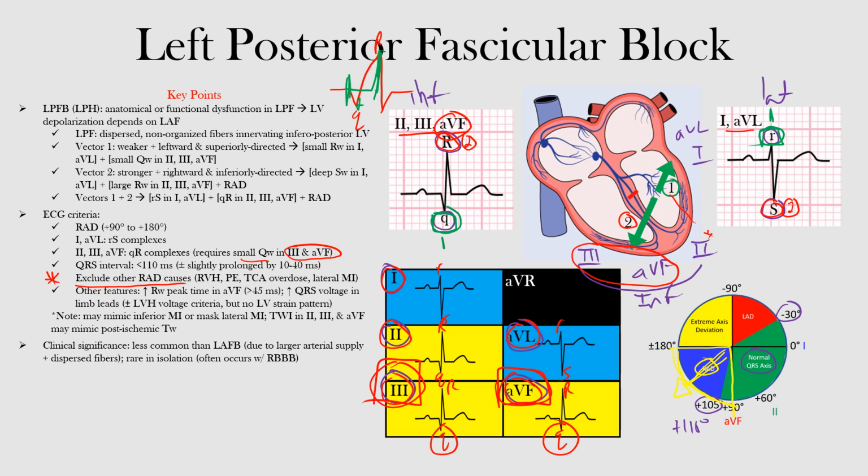And mark these points, because after we discuss infarctions and ischemia, I want you to come back to them and they should make more sense. So this is this area here. Come back to this after you look at ischemia and infarction, and I think that will start to make more sense.